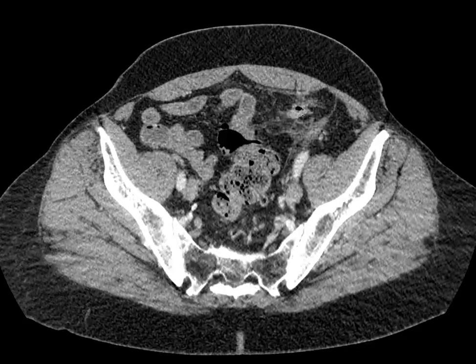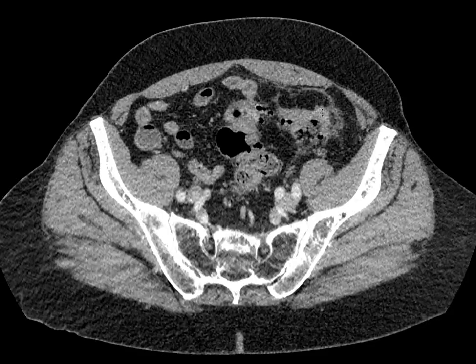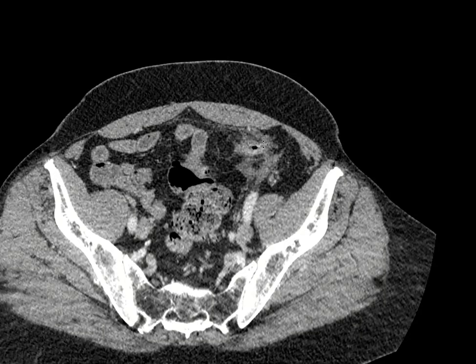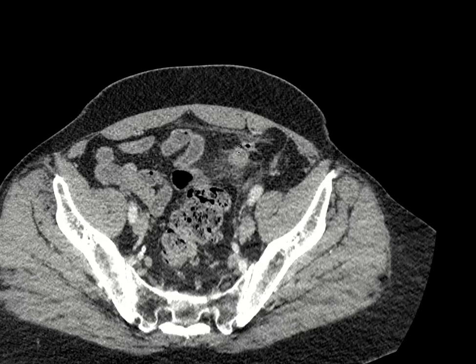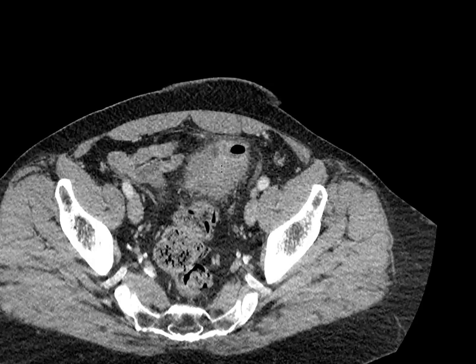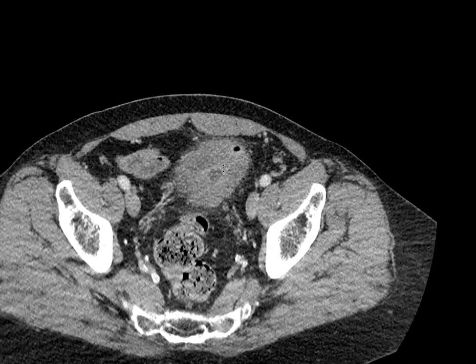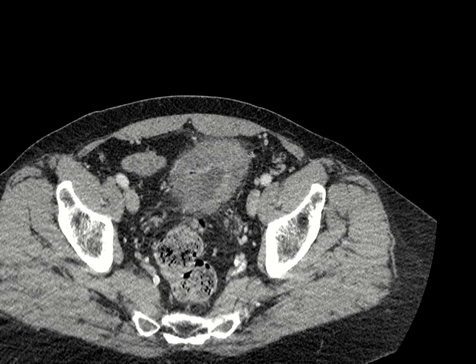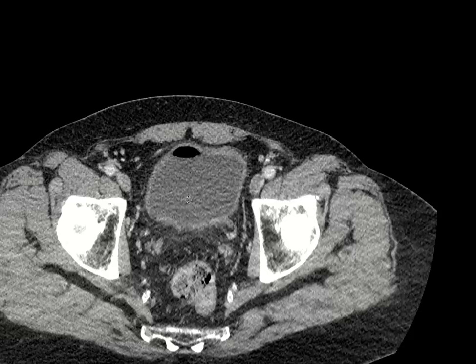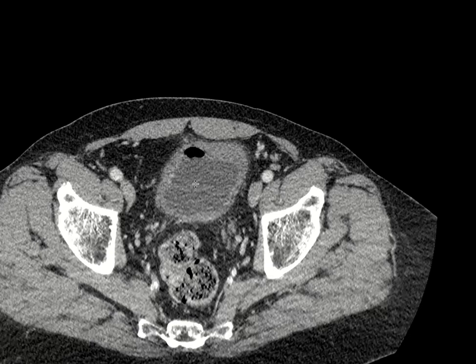but there's this fistulous tract that we can see extending from the sigmoid colon right here. If we come down, we can see this fistulous tract. There's some gas within it, extending all the way here. Here's some fluid and gas within the tract, extending all the way to the bladder dome, causing it to look thickened compared to the rest of the bladder. And we can also see that there's some gas within the bladder itself.